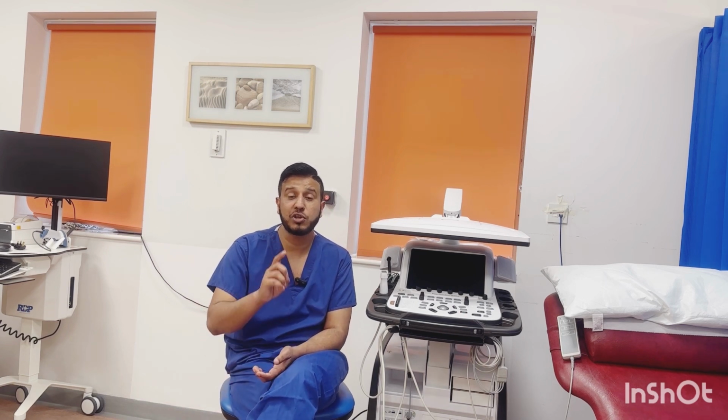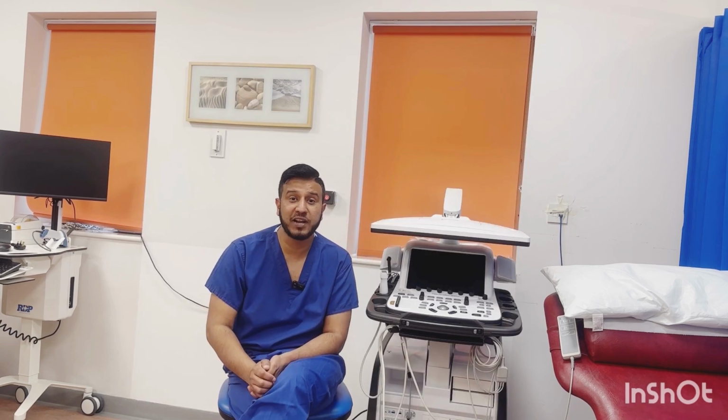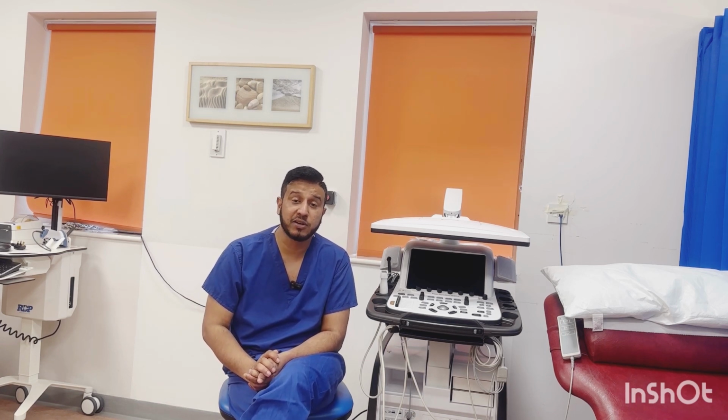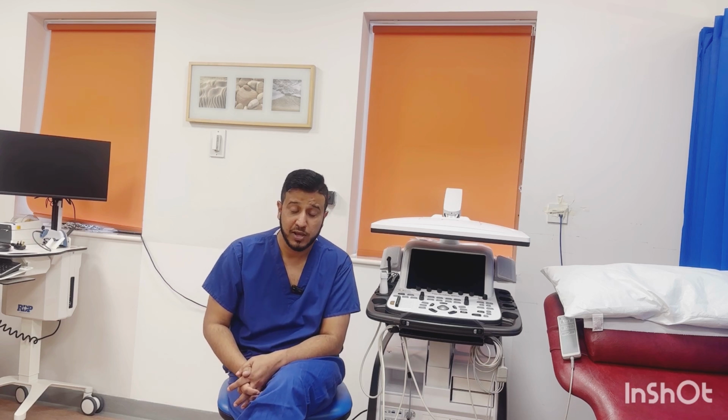You always need to keep in mind that you need to exclude the calcification to get a proper LVOT diameter. Then you also need to check where you are putting your LVOT VTI cursor and how you are measuring your LVOT VTI. So you need to look at everything very carefully.